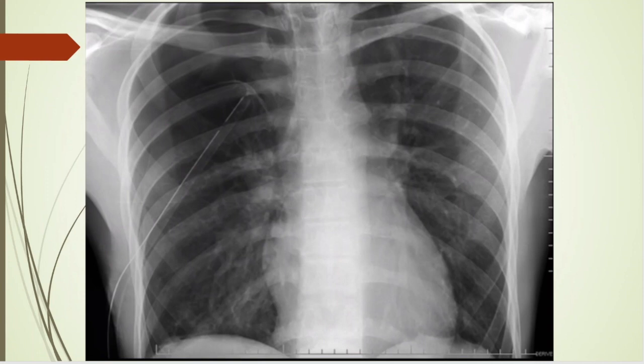And here is a really interesting chest x-ray. So parts of it are cut off. We'll do A for airway here. You can see the trachea coming down. Looks like it bifurcates about there. That looks like carina. And B for bones. So you can see the rib. That's a first rib up there. Here's second rib, third rib. They look all okay. Clavicles, part you can see. Looks all right. Don't see any fractures.